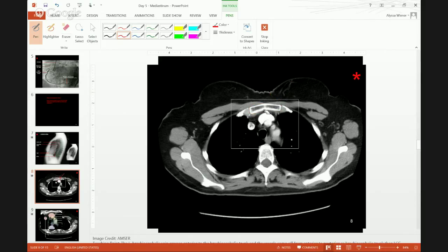If we're seeing sternum, the sternum is going to be much smaller. And this patient has breasts right here, which kind of give us a good sense that the manubrium is quite large. We can't always depend on breast being present, but here the manubrium is taking up quite a lot of space in the anterior chest wall. And we can also see clavicles coming off of that, okay? So we're pretty high up in the chest.